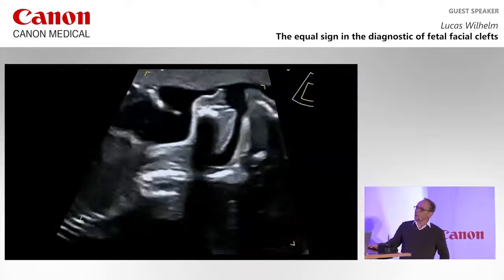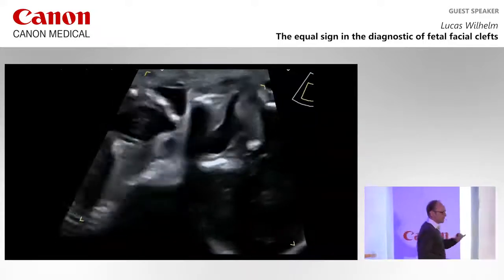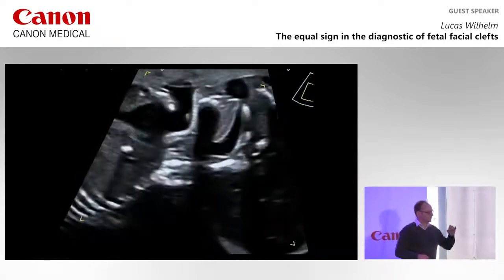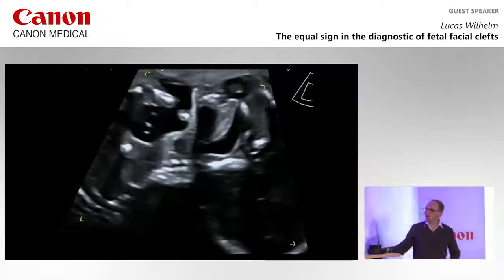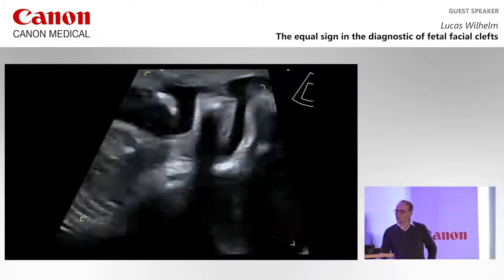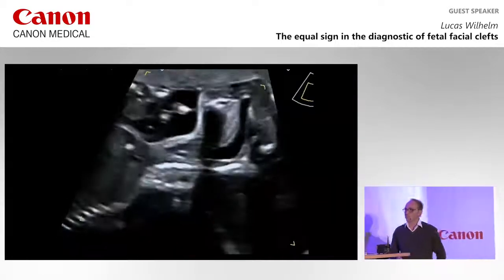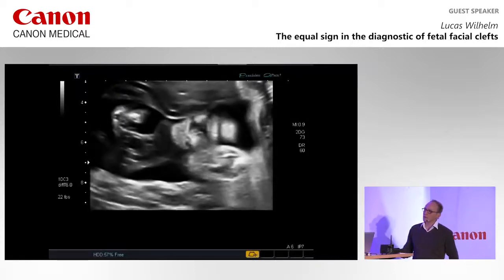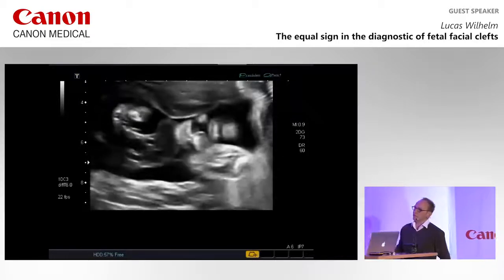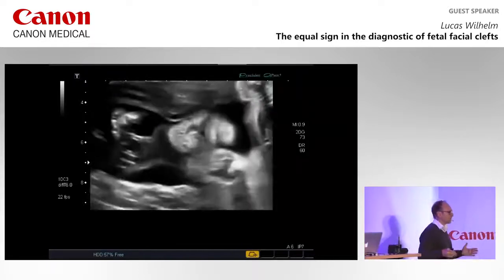Remember, in cases with cleft lip and palate, you never see glossoptosis because the glossoptosis is a function of the growth of the mandible. So in these cases, you don't have to expect any respiratory problems. Okay? So another case, you see again a unilateral cleft. Next step, check the alveolus.